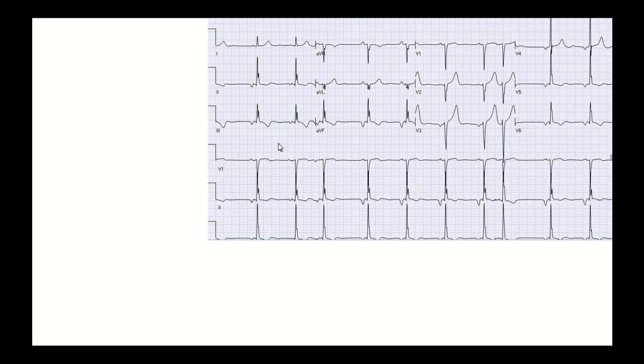The other thing to note is that the QRS here, in 2, 3, and aVF, has this reciprocating pattern to it that sometimes is called a fractionated QRS. We're not exactly sure if that is a pathologic phenomenon or not. It may be associated with electrical bad outcomes, specifically sudden death. But if it is, it's a pretty mild association.